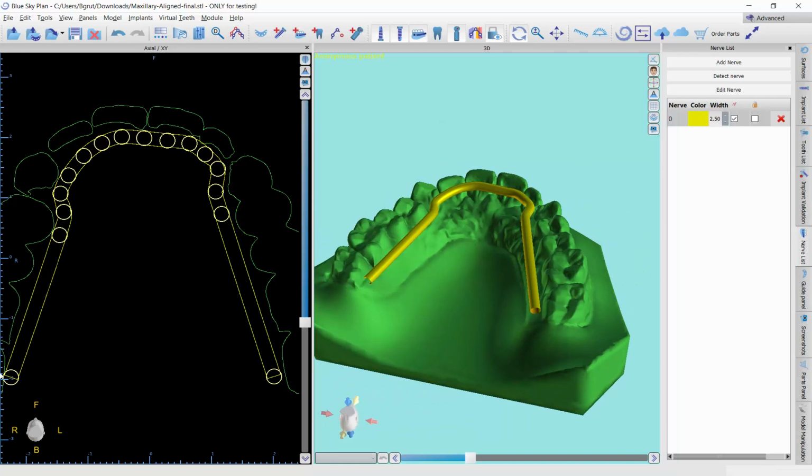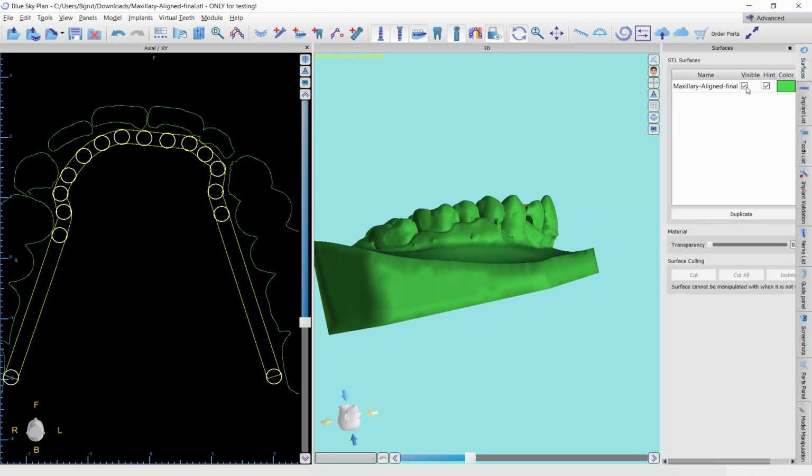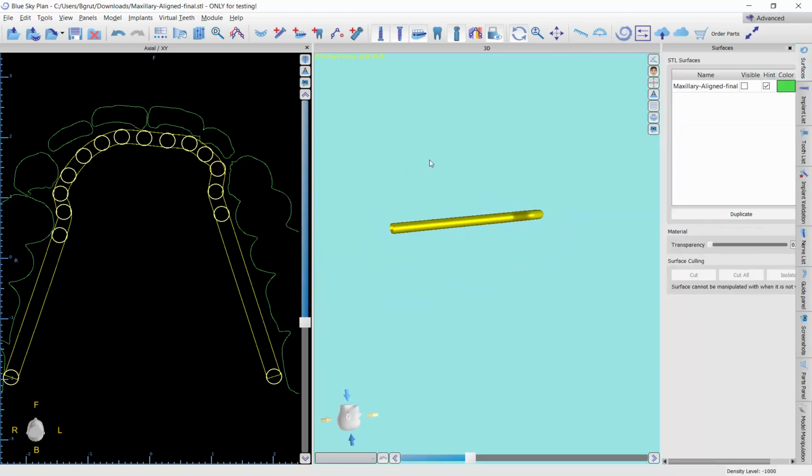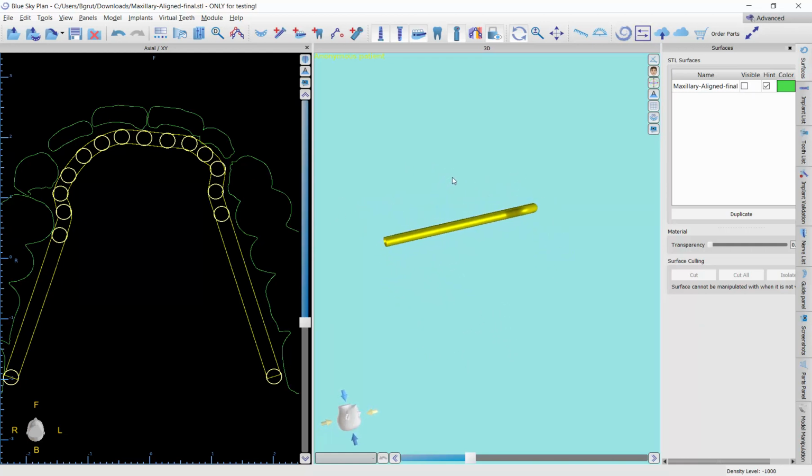The important thing is that since I drew it in this plane, you know that the curve itself is flat. So if I come up here and hide this, the wire is perfectly flat. It's not in the XY dimension, but in the Z dimension coordinate system it's flat. So anyway, hopefully that helps this particular person's question. Anyway, all right, thanks a lot.